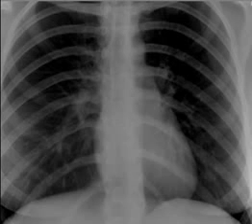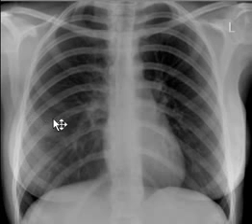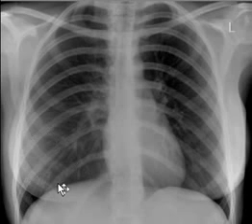Now you can also tell that this is a female patient because of the presence of both breast shadows here. Notice there's a subtle difference in the densities of the lower lungs. So this area looks darker, this area looks darker as compared to this area. This is because the breast absorbs some of the radiation, decreasing the density of the lung underneath the breast.